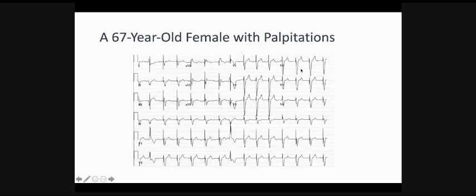All right. Perfect. Excellent. So you got the sense that this is a bit of an advanced ECG, and this is what you will expect to find in the board exam. So we're going to code this one by one.